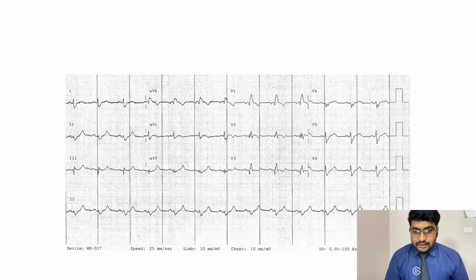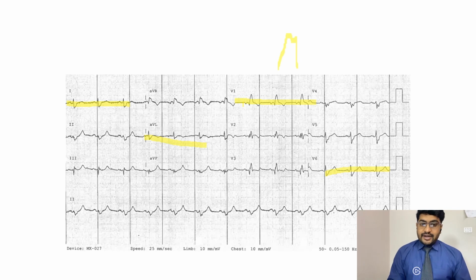One more example. In this ECG, if we look at V1, what pattern are we seeing? This pattern is consistent with a slurred R wave. A slurred R wave is somewhat similar to M. For example, if I draw an R wave and make a small slurring here, it doesn't look like M. This is a pattern you should be very familiar with. Then again discordant T changes. Our QRS complexes are broader than 3 small blocks. In V5 and V6 we see slurring of the S wave, in lead 1 and lead aVL slurring of the S wave, and our axis is normal.